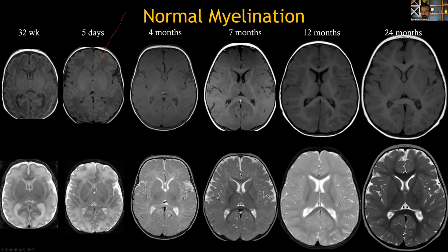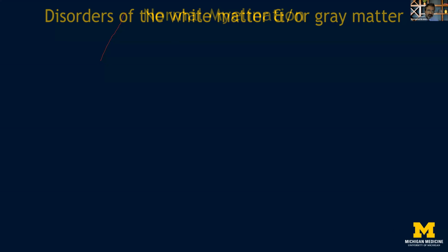By 2 years of age, the myelination will be completed on the T1 and T2 weighted images, keeping in mind that there are subtle areas of what we call the terminal zones of myelination. These areas of subtle bright signal in the juxtacortical white matter are typically seen in the frontal and temporal lobes, and sometimes seen in the periatrial white matter.